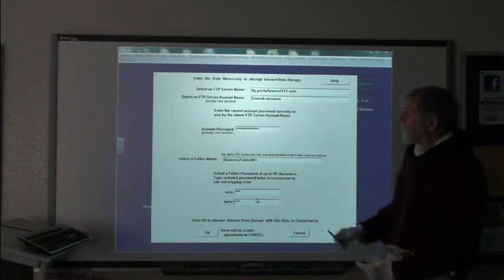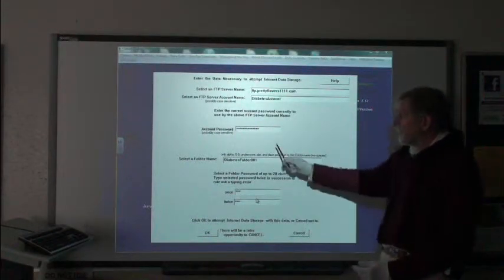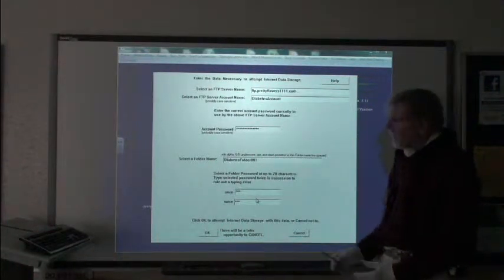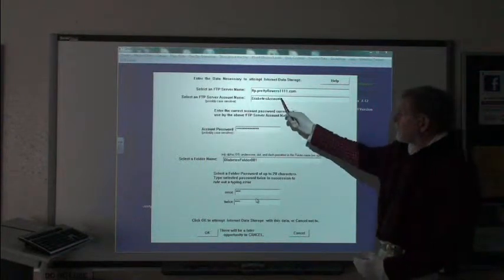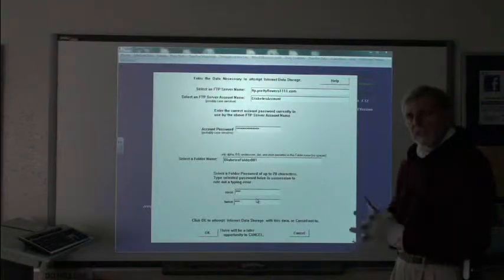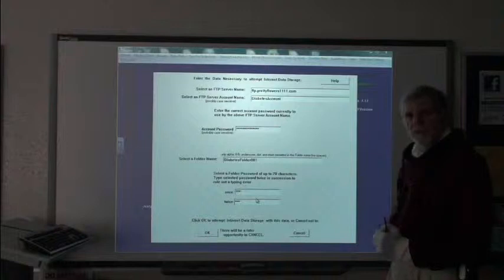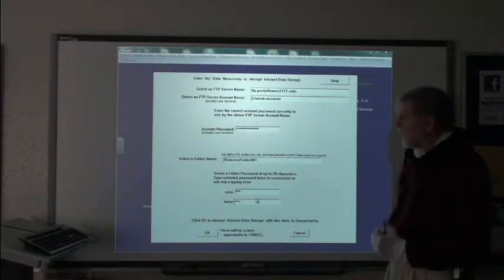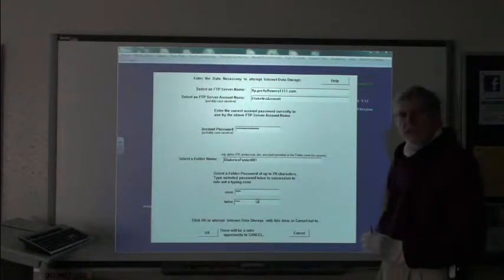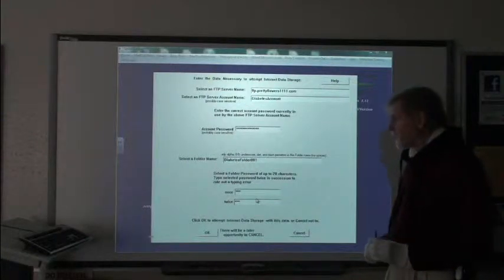The account that we created there for us to use for our diabetes data is diabetes account. And the password is 100% target zone. Now, what Level will do is inside of that directory that this account has access to, the directory entitled Diabetes Directory, Level will now create a personal folder for you by a name of your own choosing. And that personal folder is where your data set will be kept when it's out on the internet, and where it will be retrieved from in your next session.